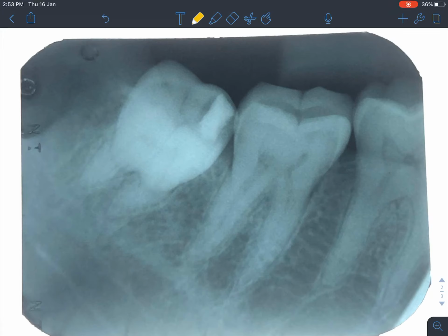Okay. So let's go back to the radiolucency. Can you draw out the boundaries of the radiolucency? Somewhere there. Yes, very good. So it's not very easy to define enamel and dentine in this particular tooth because everything is overlapping each other. That means this tooth is probably in buccoversion or linguoversion, because of which we're not able to see it yet. But we definitely know that there is a radiolucency, and it probably is involving enamel and dentine. Correct?